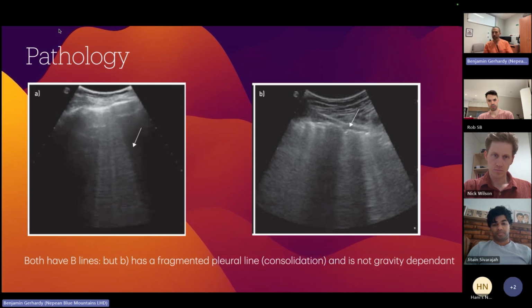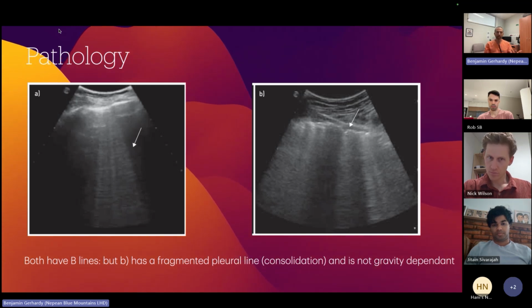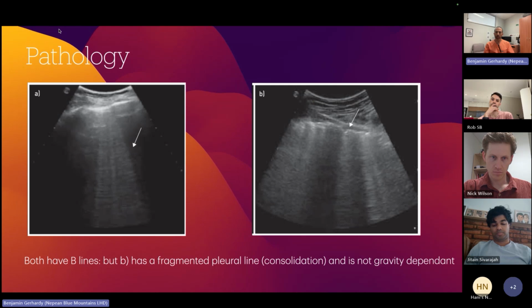That's subpleural consolidation, those little chunky bits that are missing. So that is an infective or an inflammatory process. You can look at the one on the left and say, oh yeah, they're probably wet. Look at the one on the right and say, oh yeah, it's probably infection, or at least partly infection, partly not infection. Things like that. Again, not definite, and obviously patients can have as many diseases as they please.